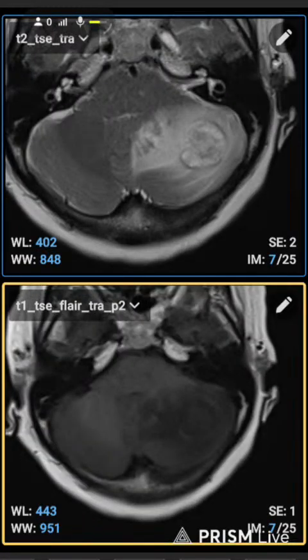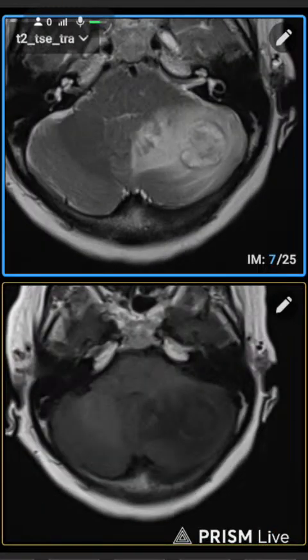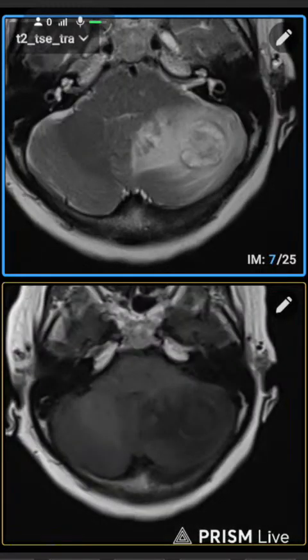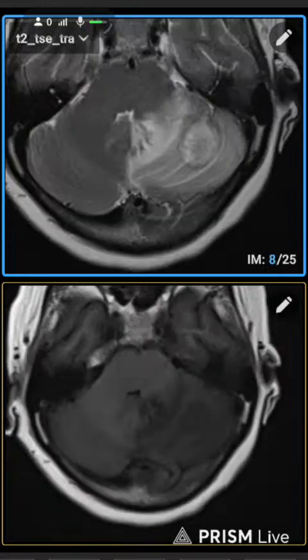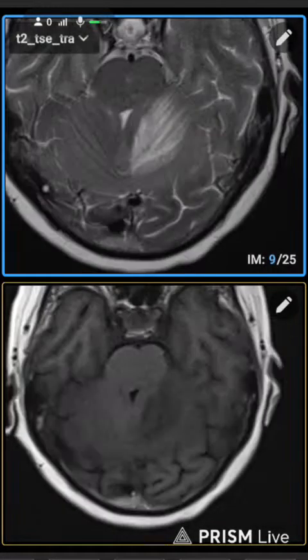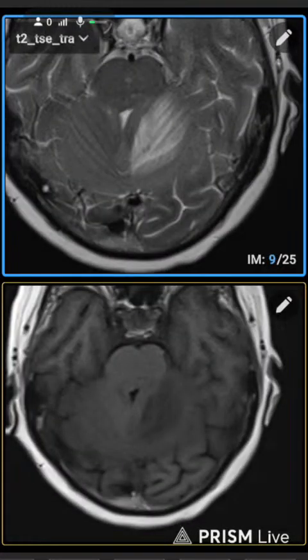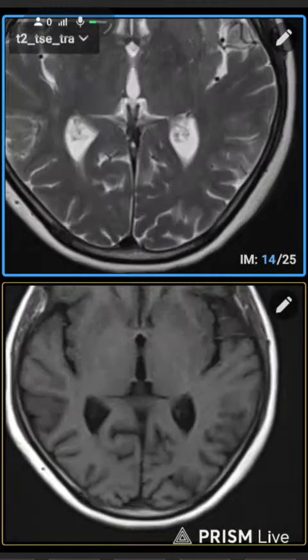I just describe what this is. I show the image with the clarification from my end, also provided by the radiologist for every case.